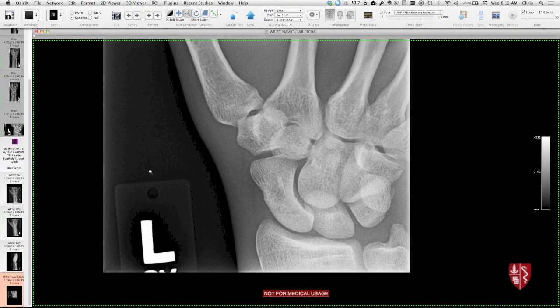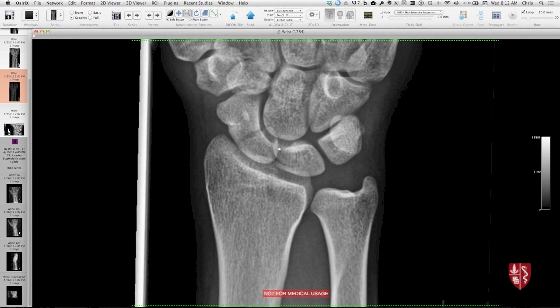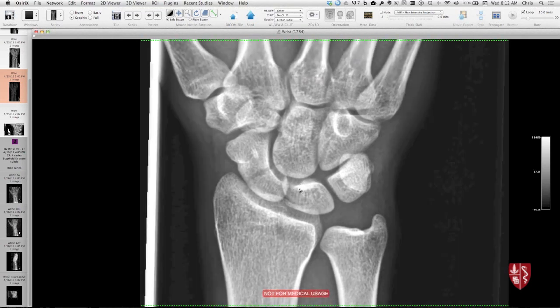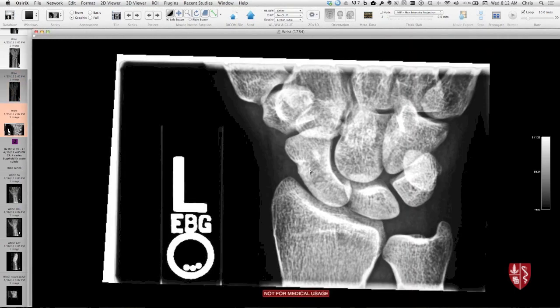This patient had follow-up, I think 9 days later, just as routine follow-up, because we did pick up that fracture. I just want to show how much easier it is to see that fracture after that time period, because what starts to happen is you start to get resorption along the fracture line as the healing response starts. So if you have a really subtle or occult one initially, and you wait about a week or 10 days, you'll often see the fracture better.